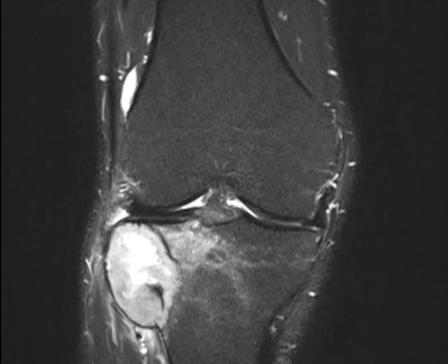Location, the cortex or medulla. We said cortex. What else? A very important thing to say for the surgeon, you have to report it: is it extending to the articular surface or not? It's a big difference. Not reaching out.